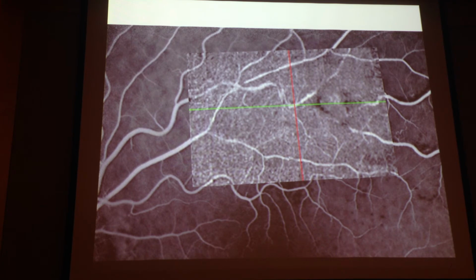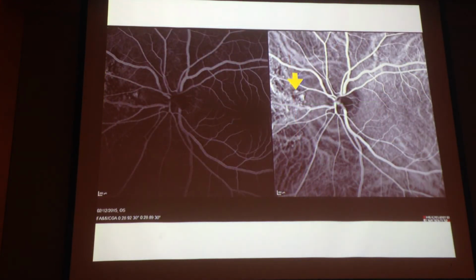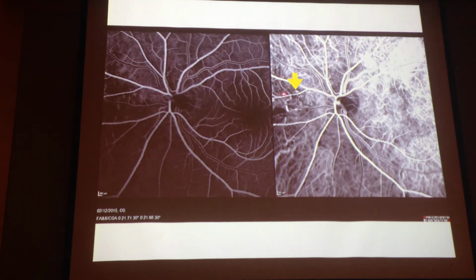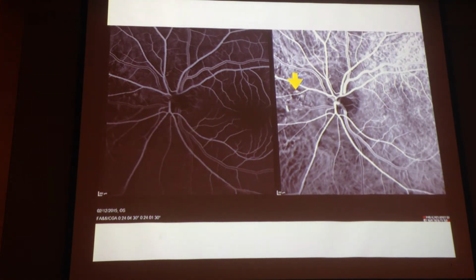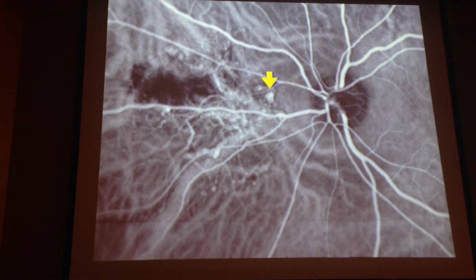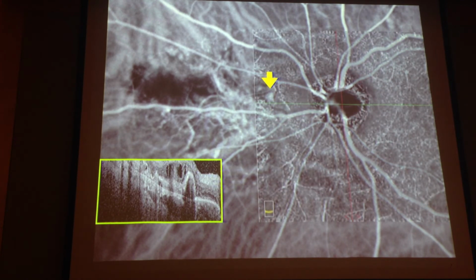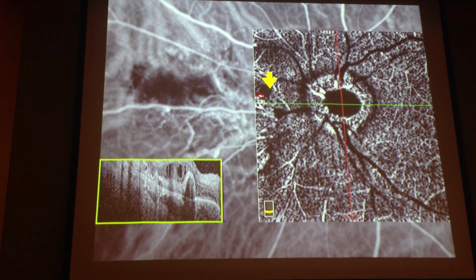For the same reason, the flow is too slow, so you don't get the image. Or in case of choroidal neovascularization, if you look at this polypoidal, you see the filling is very slow. So if you overlap to this nice polyps here your angiographies, you see that the polyp by itself is dark.